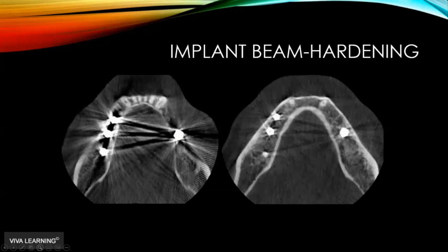And if we had a coronal view, we could make sure that they were oriented correctly within the alveolar bone. But for us to be able to determine whether they've actually osseointegrated would be extremely difficult because of all the beam hardening artifact.